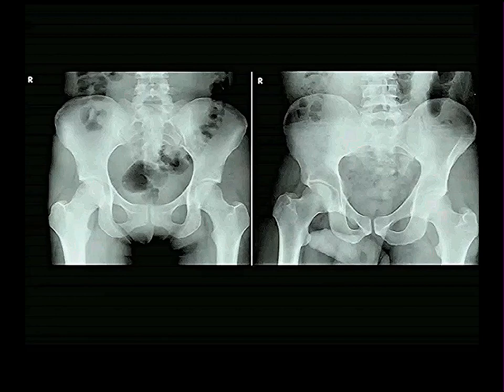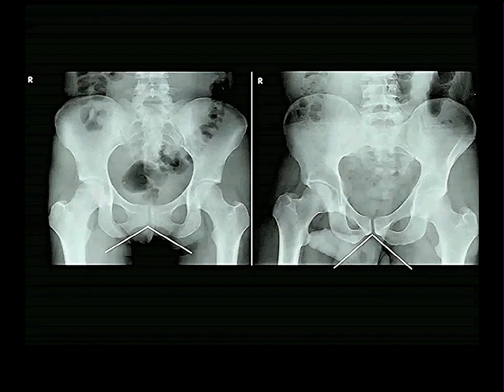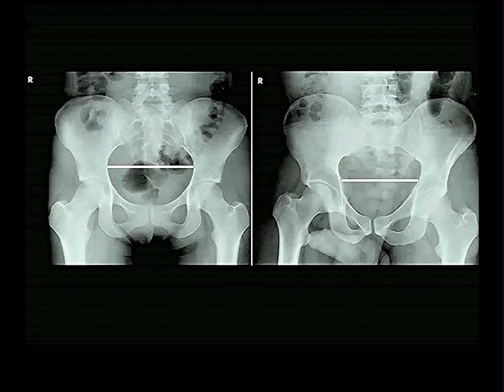There is a difference in the shape of the female pelvis from the male pelvis, because the female pelvis is structured so as to provide as much room as possible for the passage of the fetal head during delivery. One of those things is the subpubic angle, part of the pelvic outlet, which is wider in a female than in a male. Also, the distance between the arcuate lines is wider than in a male.